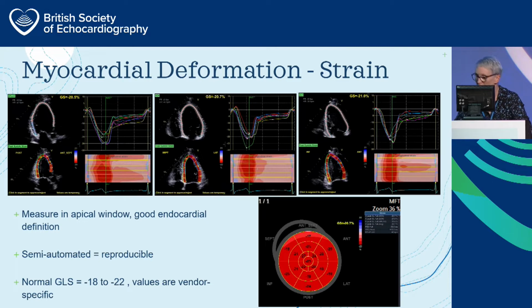So the machine will provide you, if you can see, a strain curve, and you'll also get the video, which for some reason is not playing at all, which shows you it tracking. And you can see the slide on the bottom of the slide, bottom left.